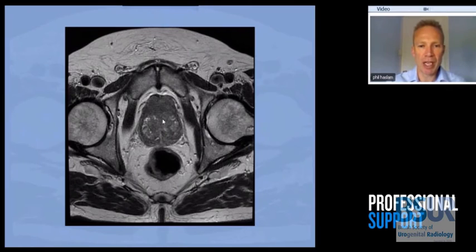But the problem this patient had was they'd already had transrectal ultrasound and biopsies, and the biopsies were all negative. There was no evidence of prostate cancer. But because the PSA was persistently raised, the patient went on to have an MRI, and I think that's very suspicious for an area of tumour anteriorly. Now you can see if you do transrectal ultrasound and biopsies along this sort of pathway, unless you put your needle very far in, which some of them aren't long enough, you would never biopsy this anterior tumour, and this would be completely missed using traditional techniques.